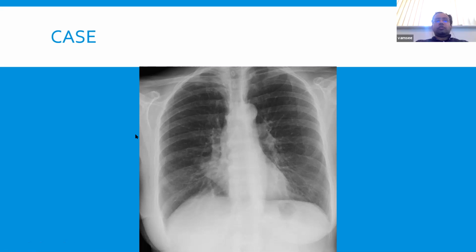Okay, if you guys want, you can just type in the abnormality that you think is on there. If people want to go the whole hog, absolutely great. If not, just throw your suggestions in the box. Give that 15-20 seconds, and then we'll go to the answer. Alex, did you want to give it a go?